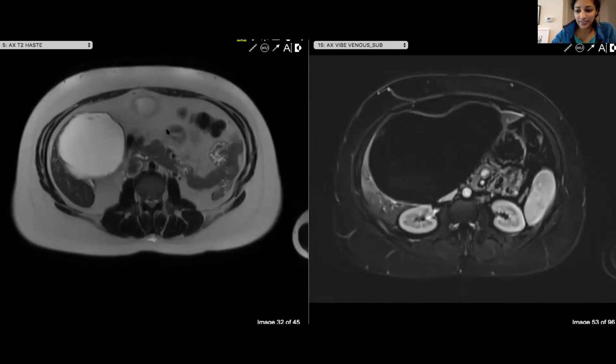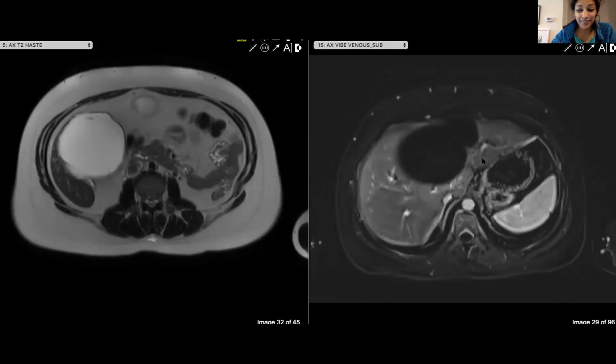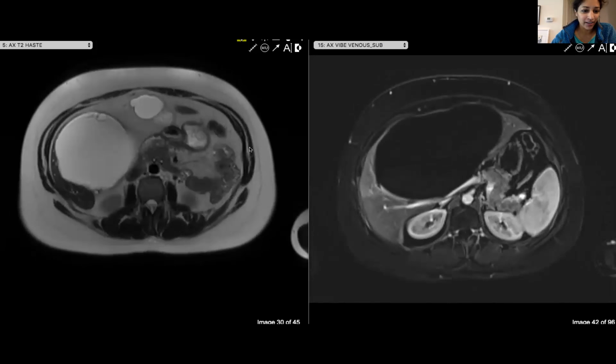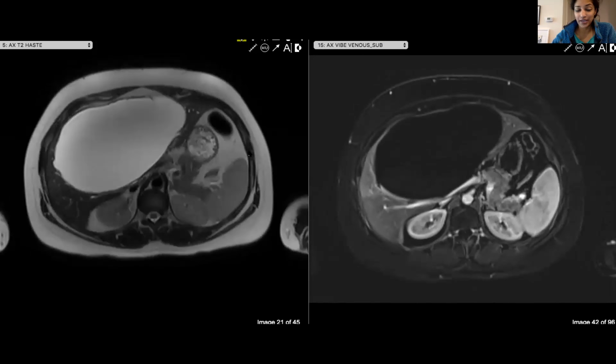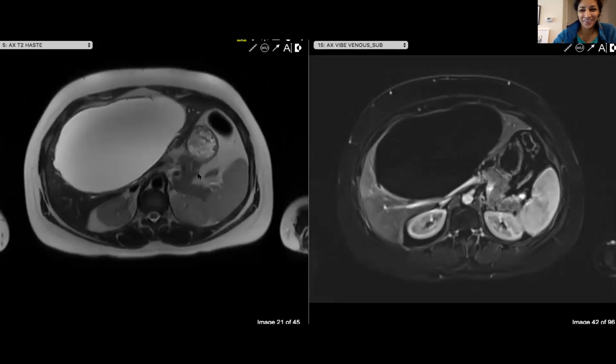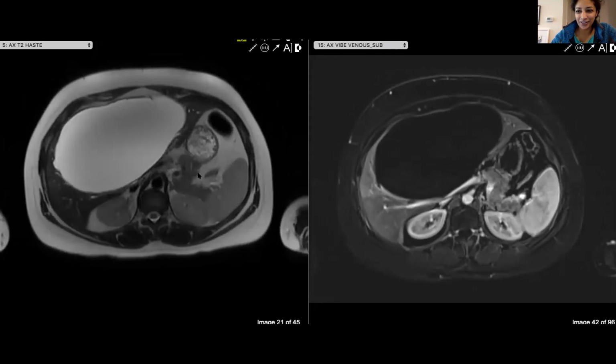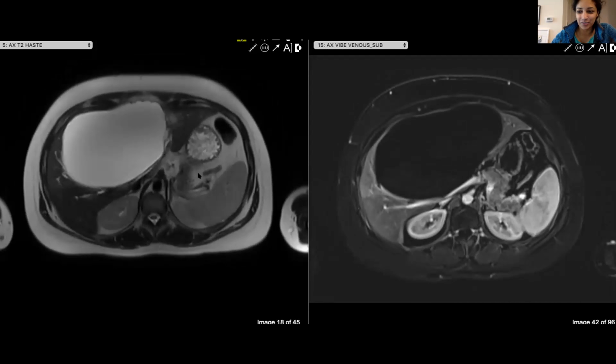So this was resected. David Fetzer also says, good location for a ciliated duplication cyst. Excellent. So yeah, ciliated foregut duplication cysts, they're usually in segment 4. I've never seen one this big, and I've only actually proposed it theoretically. None of the ones I've called have been resected. So David, do you have any other tips about ciliated duplication cysts? No, he doesn't have any other tips about that.